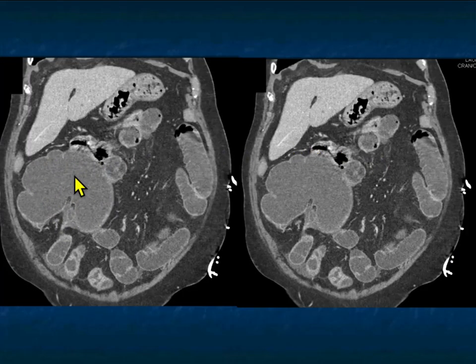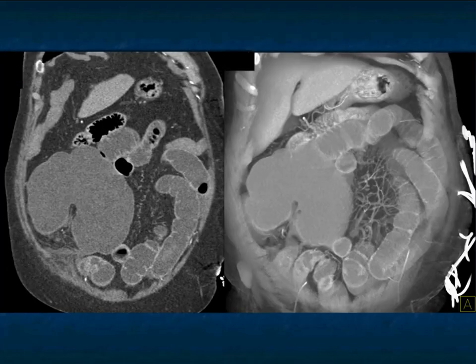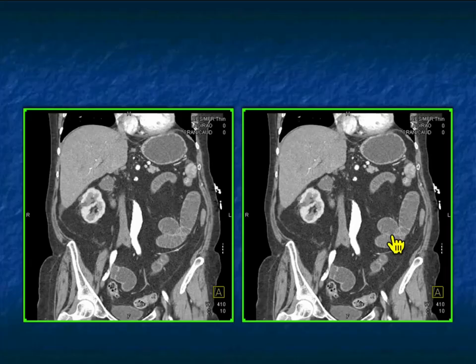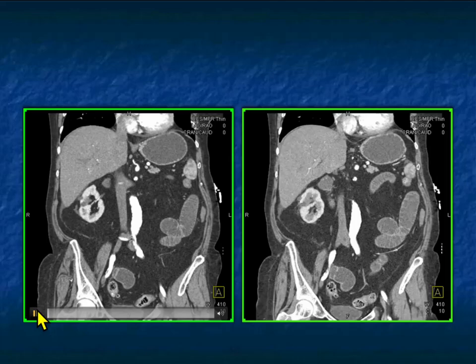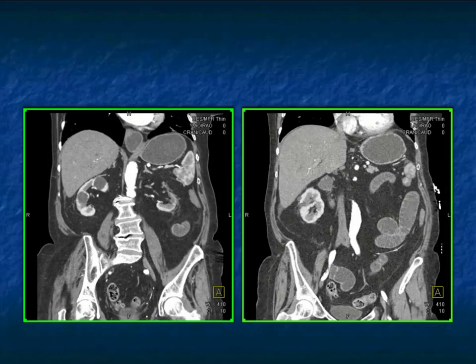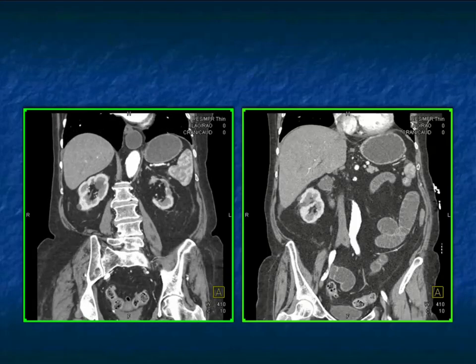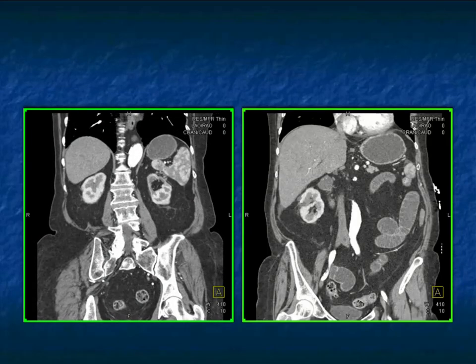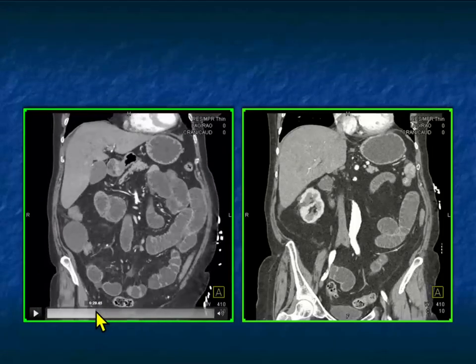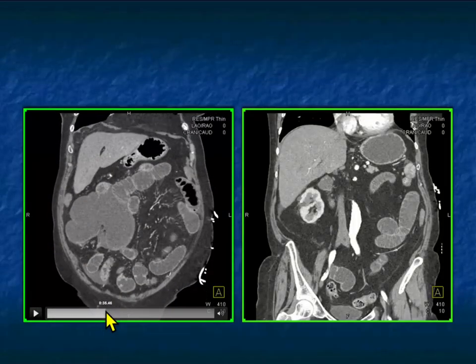This is where the ileocecal valve is. So you can see this loop here, and if I go back, the loop is really distended and kind of twisted. There's inflammation in the right lower quadrant. The vessels are all stretched. Vessels are small. Looking at it interactively, as you look into the aspect of the vessels, we want to look at the SMA, we want to look at the celiac, we want to try to follow the bowel loops downward, and that becomes very important because you can see the dilatation, then you can see the twisting.